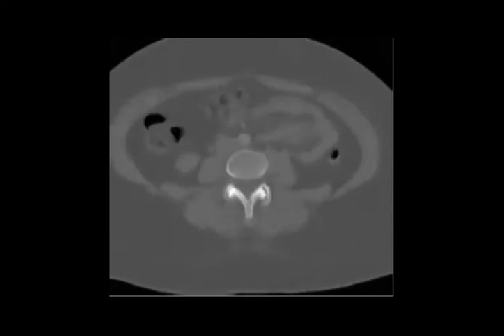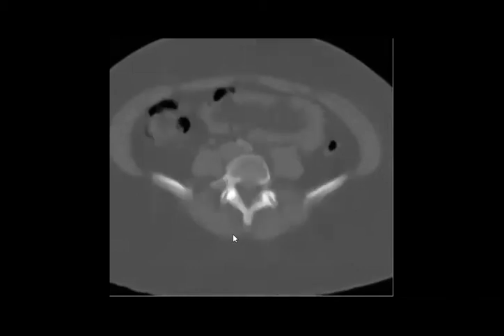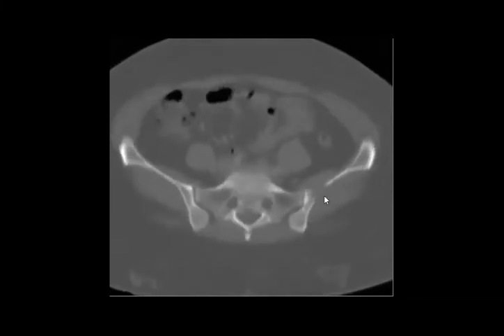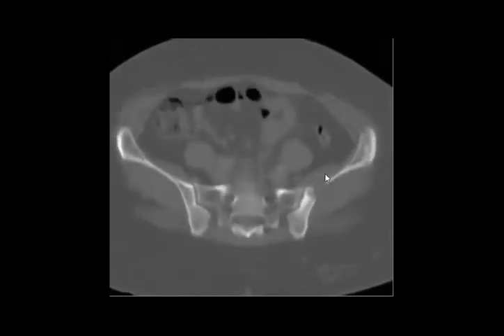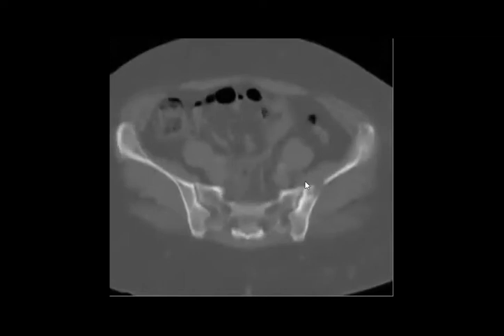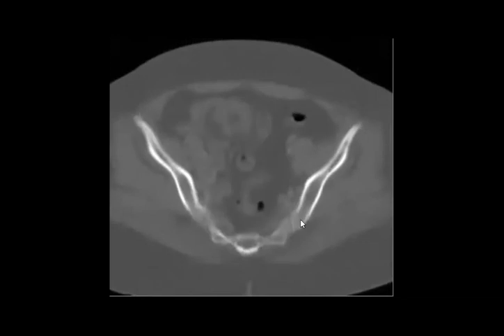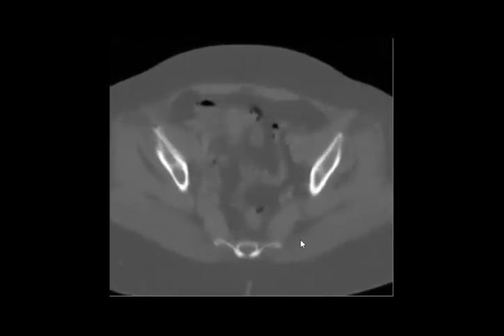So take it slowly. Yeah, multiple lytic lesions, perfect. So again, multiple lytic lesions, you will suspect one like this, okay? But this one, you are very sure that it is a lytic lesion, right? Perfect, you saw it. And here again, another one, and here again. So multiple lytic lesions. So what do you expect now to be?